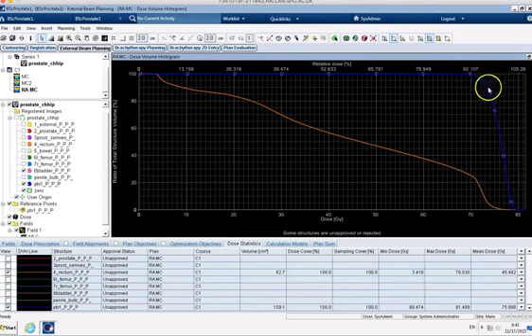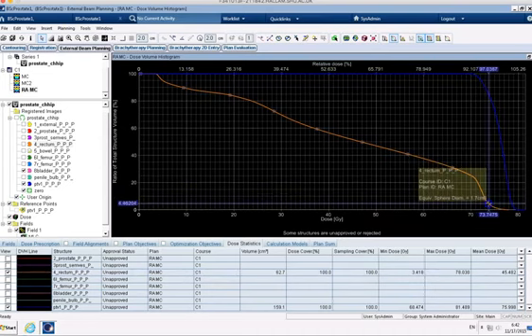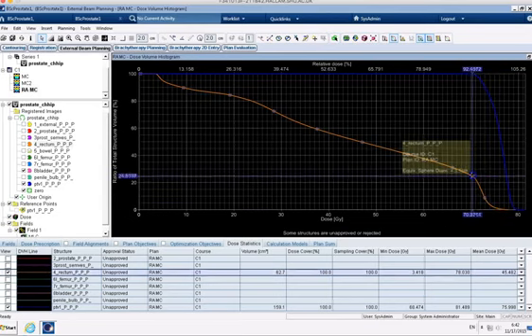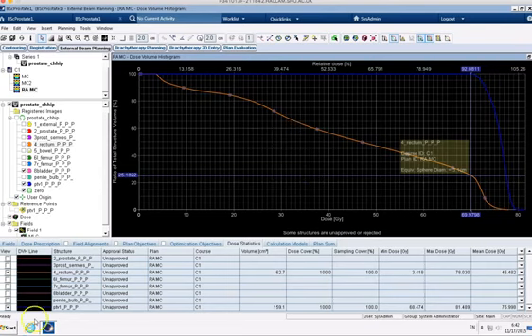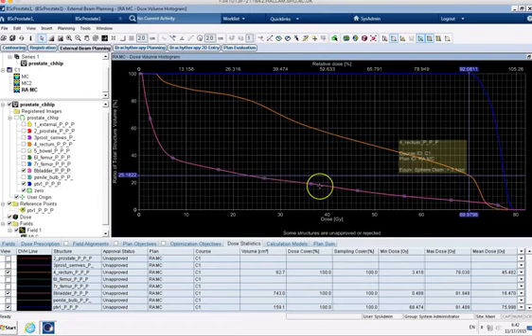Okay, so I can see straight away that that's not looking quite right. Looking at my rectum tolerances, I can see my V74 should be less than 3%. So we're not a million miles off there now, are we? And what was the other one? V70, 15%. So we're quite a bit over on that one. So that's the priority. Obviously, when you do this, you need to spend a little bit more time than me going through them and seeing exactly where we are. For me, the priority is this point here and getting my PTV coverage sorted. And obviously, we've added the bladder into the optimization now, so we can have a look at our bladder.